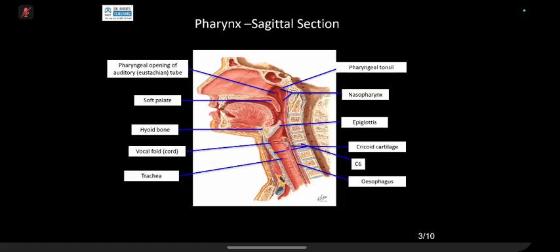But generally speaking, there is a landmark there. What is the landmark? The landmark is this cartilage. This cartilage is a complete ring. This is the lowermost cartilage of the larynx, which is known as the cricoid cartilage. So inferior to it, you must have heard this name, postcricoid carcinoma. So technically you are in the esophagus there, but practically it might be in the ENT territory. And your territory then starts from here downwards.